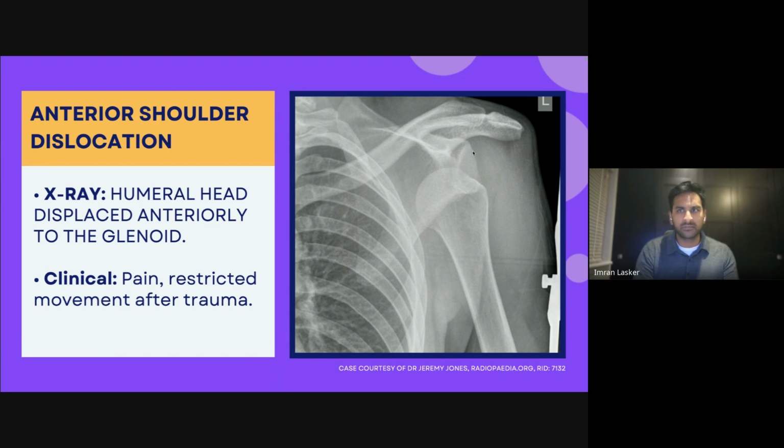And so bony reasons, it looks completely fine, but they're saying it's very unstable. It kind of comes out, pops out, and goes back in by itself. And sometimes you get proper fractures, like this bone is completely gone. Sometimes it's moved away. You've got a big dent sitting over here, and that makes it very, very unstable. And what they actually need to do is go back, get that fragment, and just nail it into place.